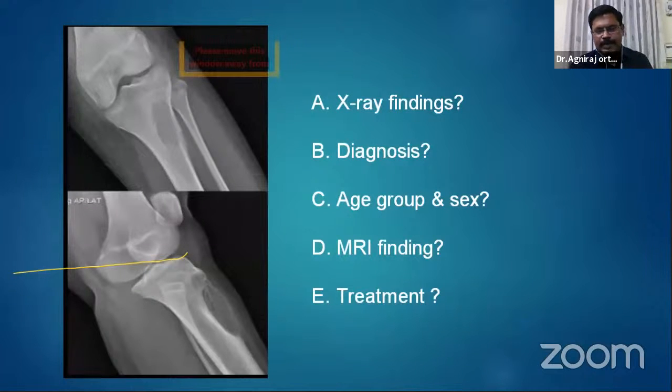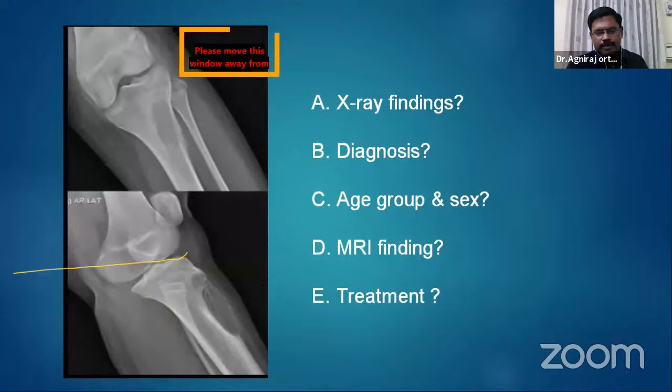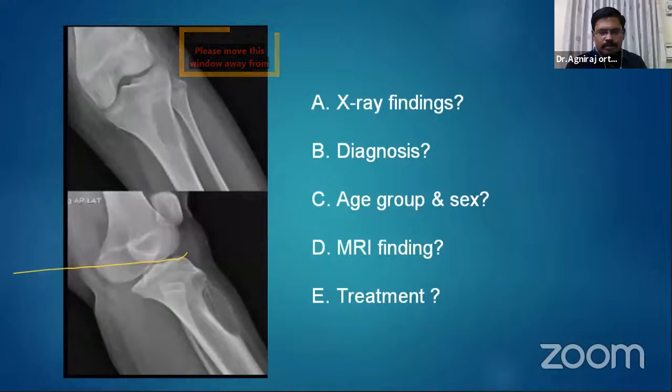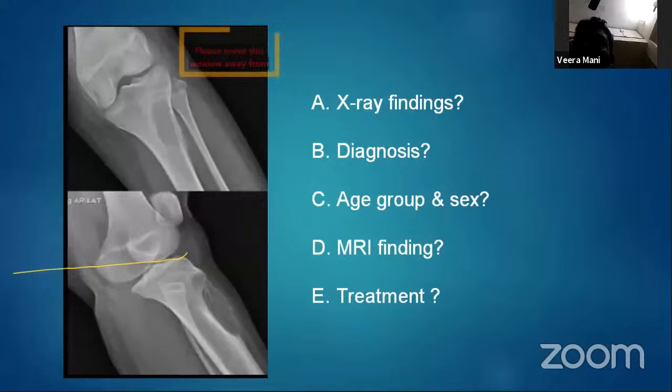Okay, what is the treatment for aneurysmal bone cyst? Treatment means you should say the treatment of choice for this X-ray. Sir, extended curettage. Okay, then? Sir, with embolization if needed, sir. If there is any arterial bleed, embolization. Okay, the treatment is not complete. When will you do the embolization, before or after the curettage? Sir, before the curettage.